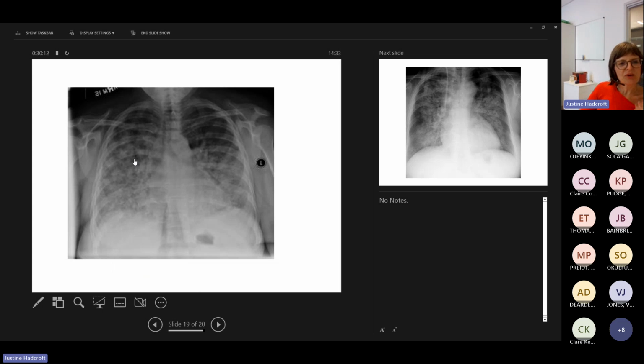bacterial pneumonia, but I would expect somebody with this degree of bacterial pneumonia bilaterally to be really poorly, and they don't even seem to be on any oxygen. And we can't see any endotracheal tube in the trachea, so probably less likely to be bacterial pneumonia. Could be interstitial lung disease, I suppose. It could be, and it probably was.